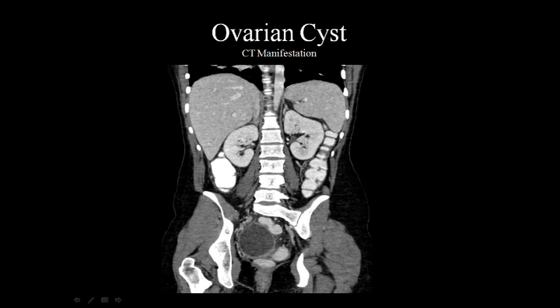So here we have pretty much what would be just a functional ovarian cyst. Notice that we have a wall and we have a homogeneous appearance inside here. Notice that we don't see anything that's really abnormal. It's just an ovarian cyst on the right side.